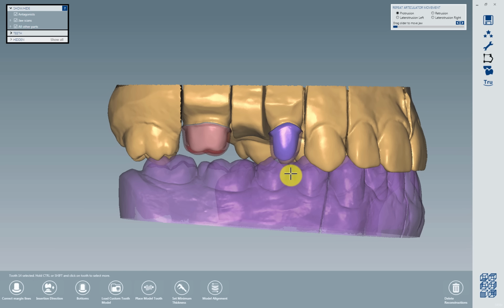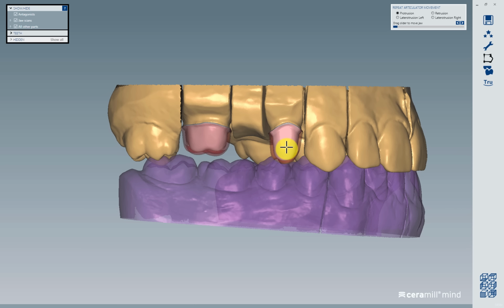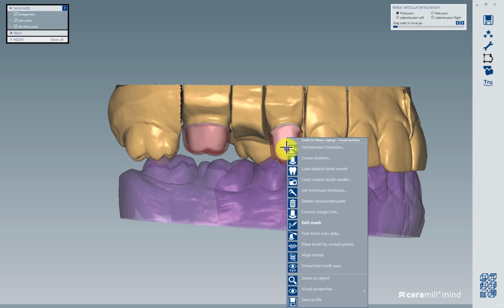If even more special editing steps are to be performed, then there is, as also in the previous user interface, a large number of tools available for selection in a context menu using a right click of the mouse.